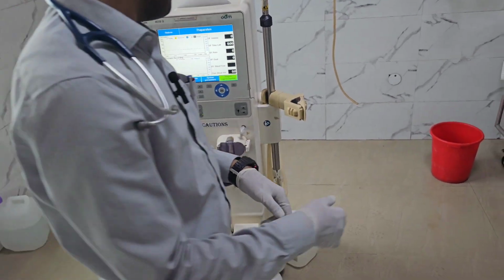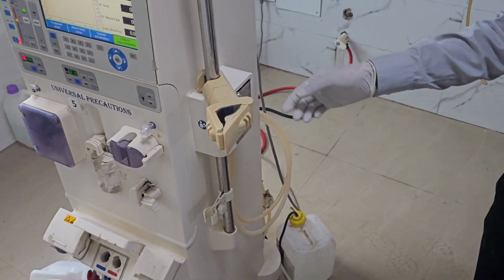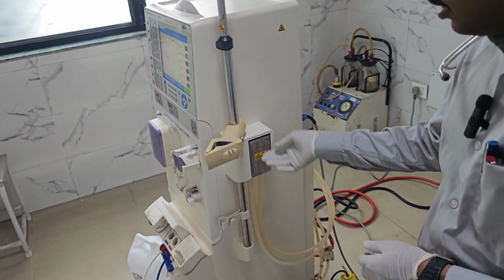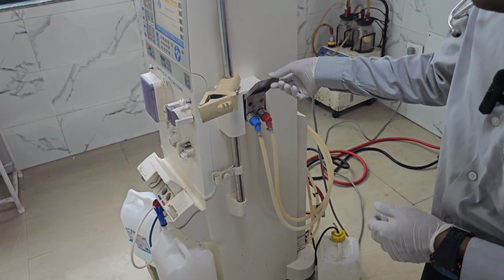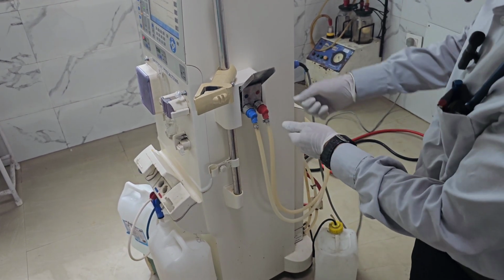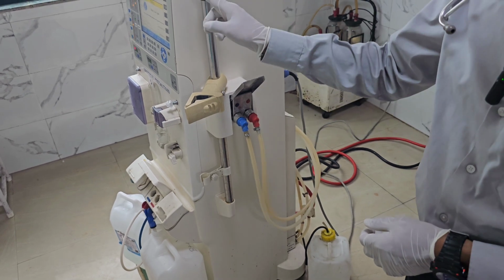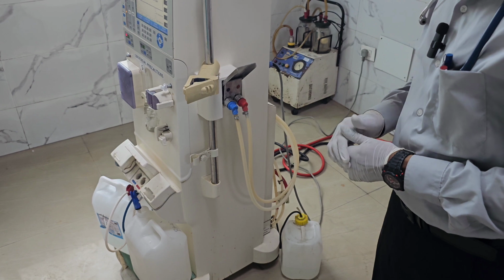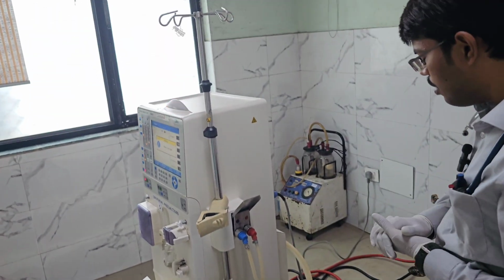And then the side view, you can see here. This is the dialyzer holder. In many Nipro machines, you will be able to see the coupler on the outside part of the machine only. Here, the dialyzer coupler is here. So you do this, the coupler will come, you take it out, connect to the dialyzer. From here, dialysate will come, enter the dialyzer, and go back to the machine itself. So this is regarding the front part. This side part we have seen. We'll come to the back side.